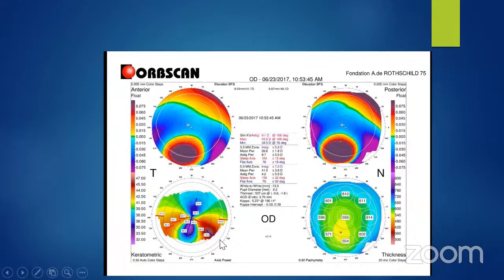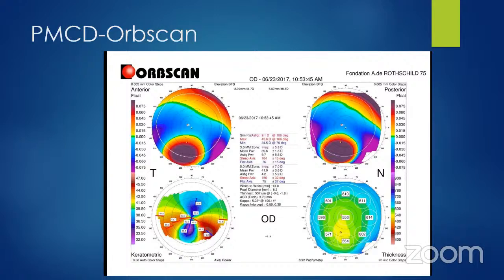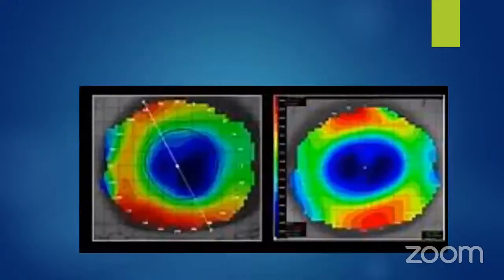What is this looking like? Just now we described it. Yes, see? So you can't see each of the values, but you can see that there is a steepening which is happening like the crab claw pattern. Okay. Yes.